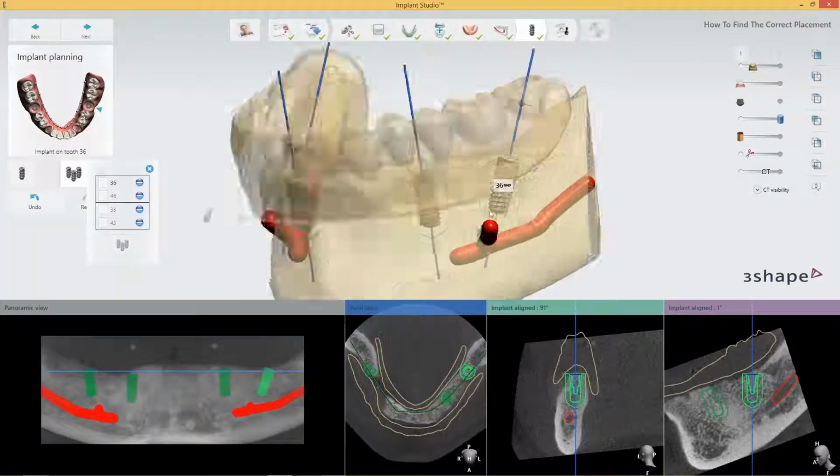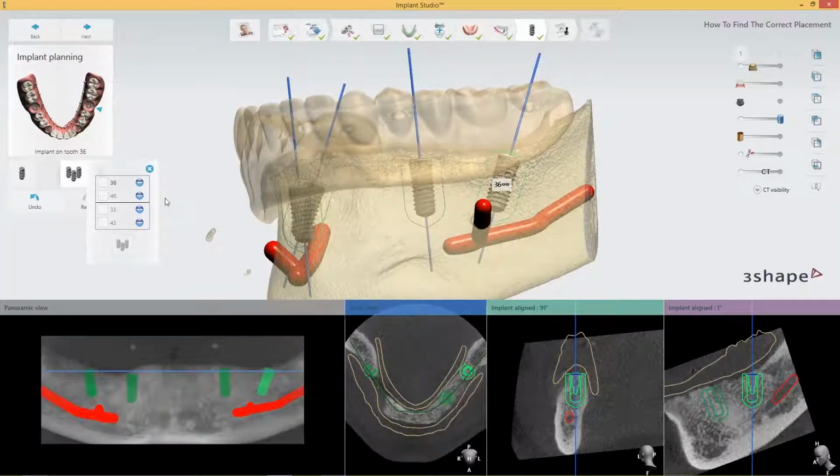But the functionality to create more groups is definitely there. Very good. And I can really see the use for this, especially on one side, on the left side or on the right side, because you want to have approximately the same insertion direction, so you know that it's fitting passively. So there are no actual strains on the bridge and so on. So this is really good.